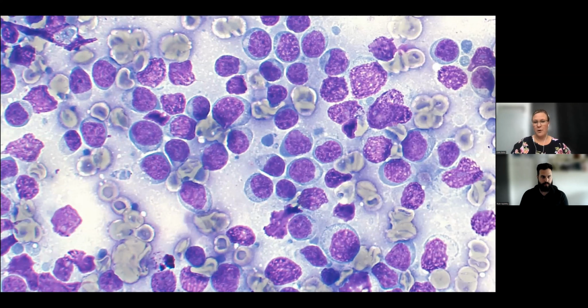And what we already can tell is that there is a lot of cellularity here, which is always a good thing in cytology. We want there to be cells there to look at. And like I said, sometimes we get samples in these cases that are not highly cellular, and that just may be a nature of the beast. Maybe the actual thickening or mass is not big enough and it can be difficult to hit. But in this case, we automatically have a lot of information in the cytology.